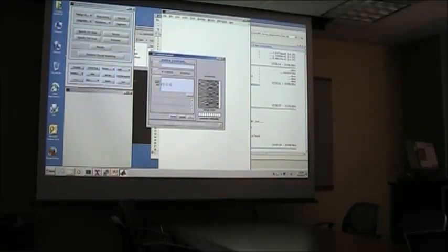Here, I'm contrasting the first two against the second two. The first two are for non-famous people, and the second two regressors model the response to famous people, right? Does that make sense? So this would be non-famous larger than famous.